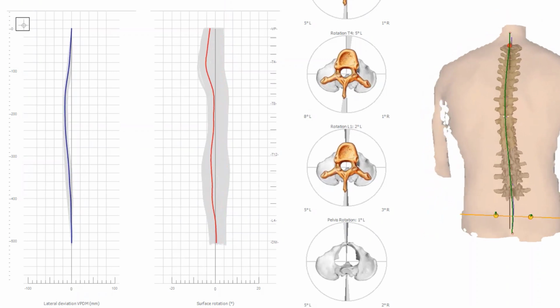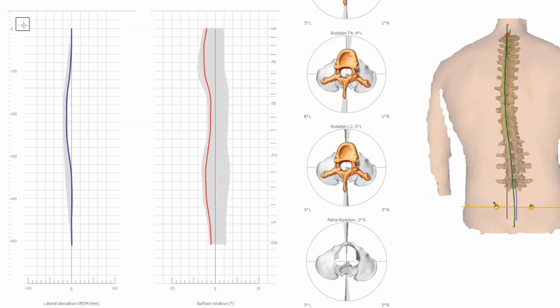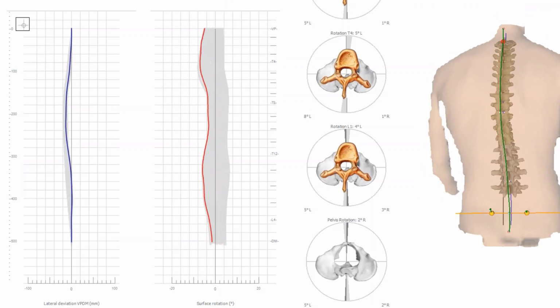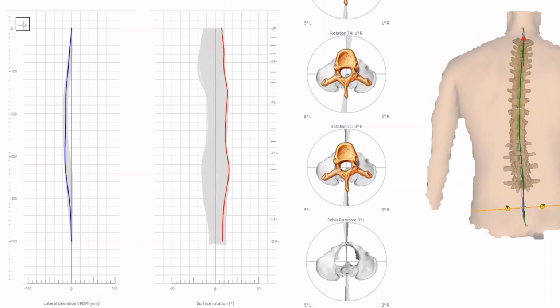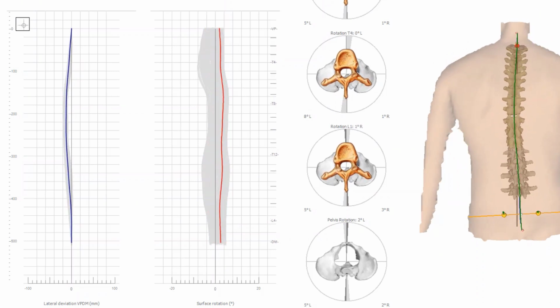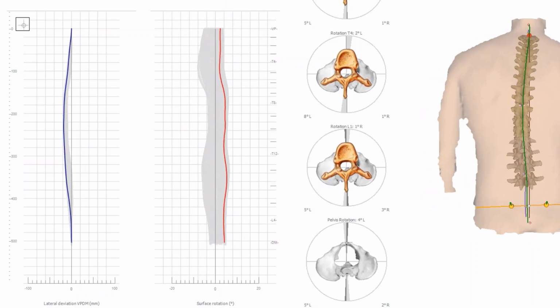When it comes to the course of the red line, we enter a primarily subjective part of the analysis. When analyzing this line, always let the video run so that you can see the course of the movement. The still image of the red line can become interesting at a later stage, but usually only if the foot motion was recorded in combination with a foot pressure measurement and/or a video gait analysis. Let us come back to this in a moment.